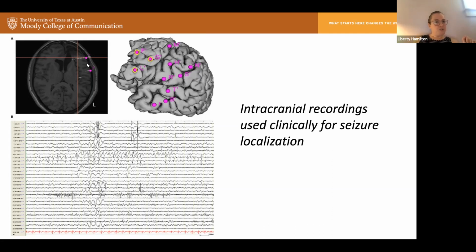In any case, from each of these electrodes, you will be recording the electrical signals from these electrode channels. And that's going to record the local field potential at each of these channels. And in my lab, we process these in a particular way, and I'm going to share with you some of the code that we use to do that. But this is just showing an example of some raw electrocorticography or iEEG data. And this is collected throughout those 1 to 2 weeks.